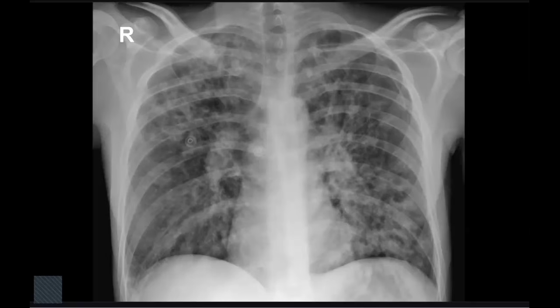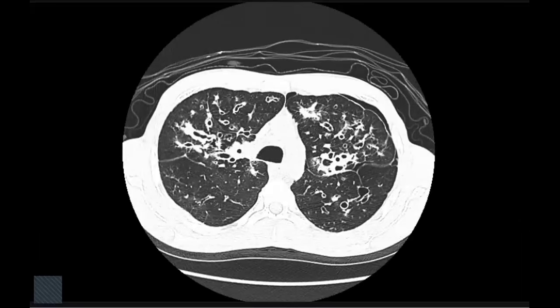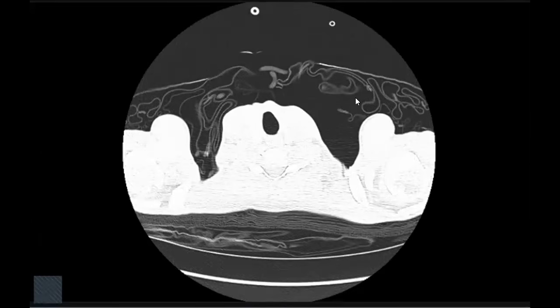through both lungs. I would compare this with the previous. I would ask about the history of this patient, and I would go for CT. For sure, I would urgently refer this for a chest tube to treat the pneumothorax.